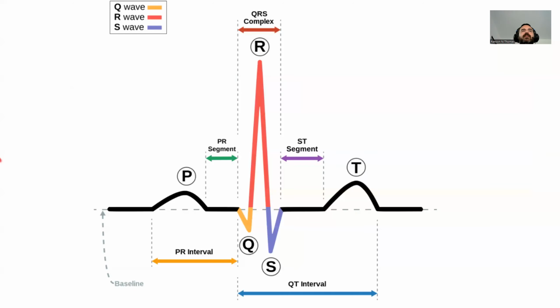First thing, this basically straight line that you can see, with the little dash line through, is called the baseline. You can also hear it called the isoelectric line. The isoelectric line is basically 0.0 on your x-axis, right? So moving across, that's the isoelectric line.